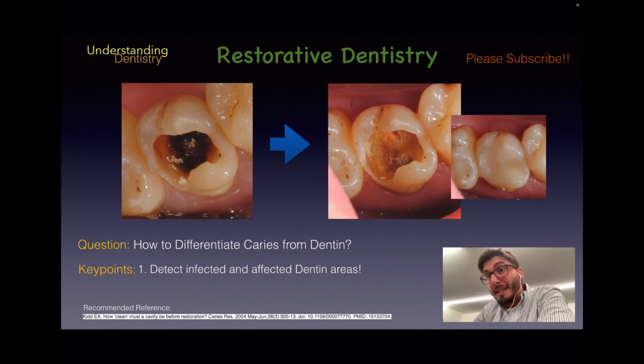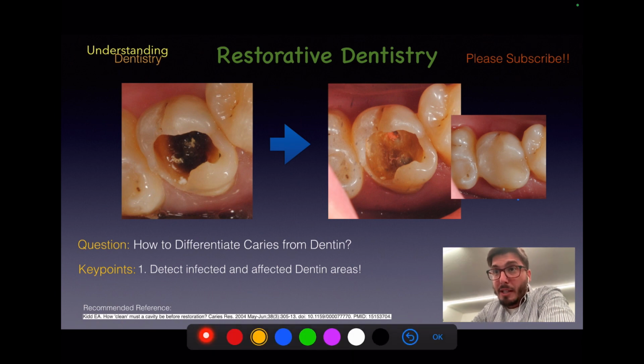But there is actually a mistake here which allows me to see the different shades of dentin, and the mistake is basically that to treat this root canal I failed to expose the entire pulpal floor, okay, so the floor of the pulpal chamber, right? So if I did expose it, then you guys would be able to see a dark line connecting the 3 root canals, okay, so more or less in this area, so we would have a darker line of dentin here, because this would be the pulpal floor, okay.